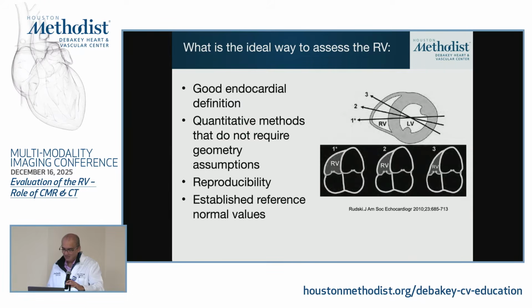So as a result, you really want to think of the right ventricle from a three-dimensional standpoint. I'm going to show you why it's important, where looking at a single 2D view may not be completely representative of the size of the right ventricle. If I show you three example scenarios here, these all look like four-chamber views. Example 3 is a four-chamber view that's cut a little more anteriorly, going more through the anteroseptum, and because of the shape of the right ventricle, if you cut it here, the size of the RV you get is smaller.